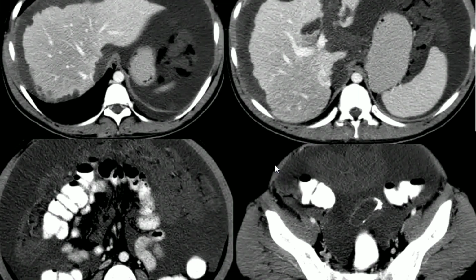It could be pseudomyxoma peritonei, but the scalloping is not clear. My diagnosis is that it could be metastatic disease with abdominal pelvic ascitic collection, and it could be any primary of.